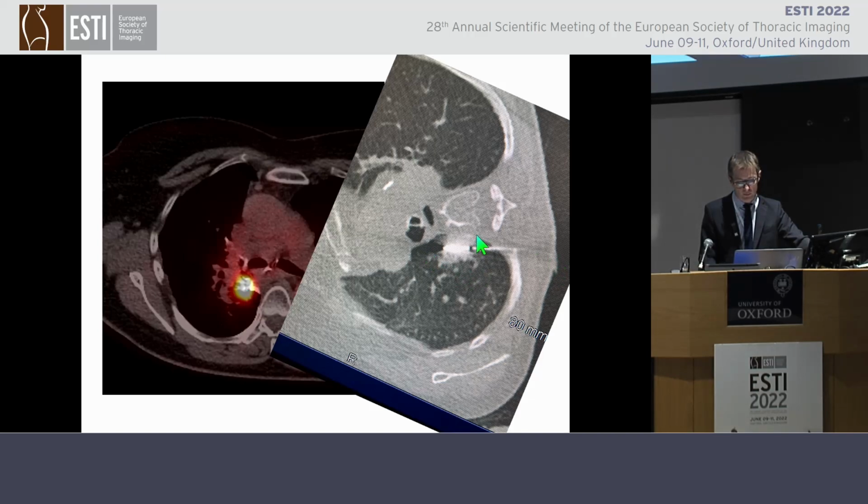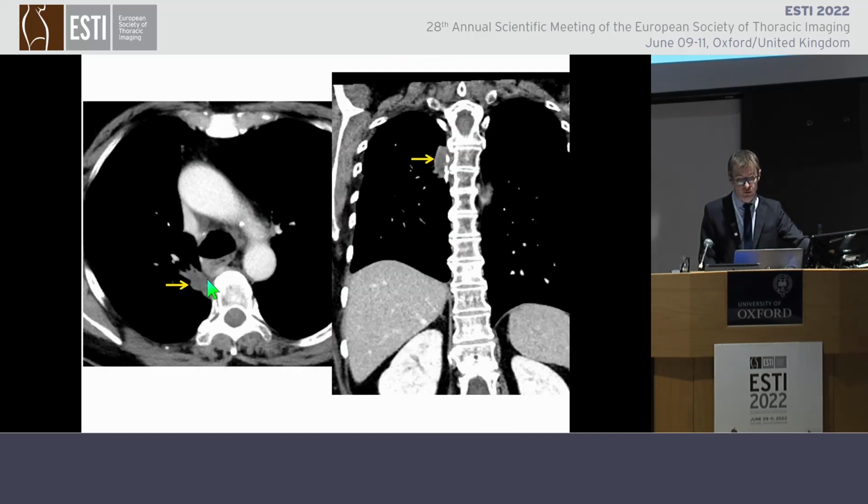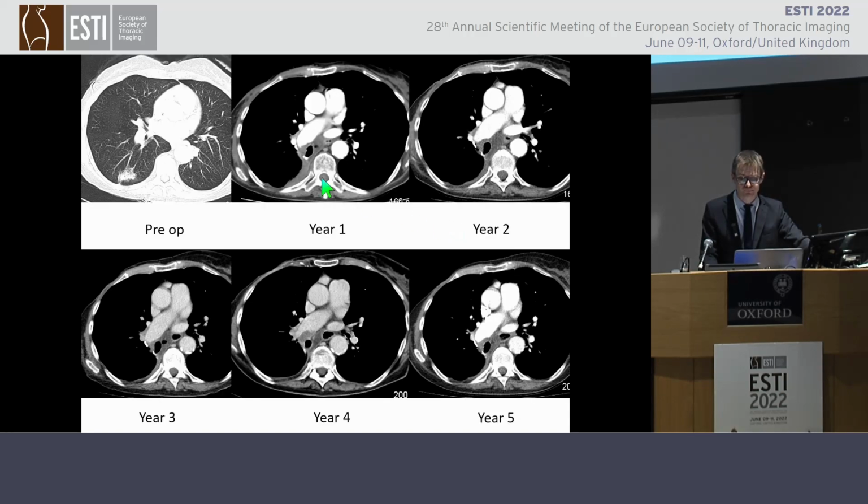So what I did was I did a microwave ablation of the lesion, and we have had a very good response to this, and on 2 years follow-up, we've had no recurrence. So there are salvage options available for these patients, so it's important to identify the recurrence as soon as possible.